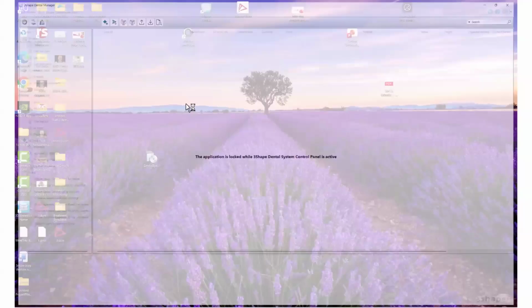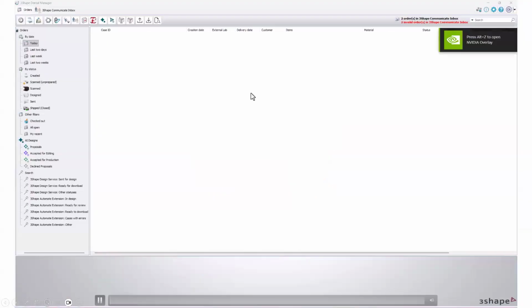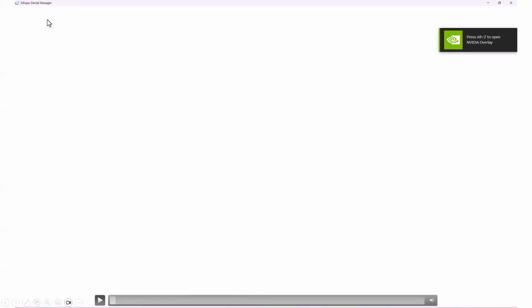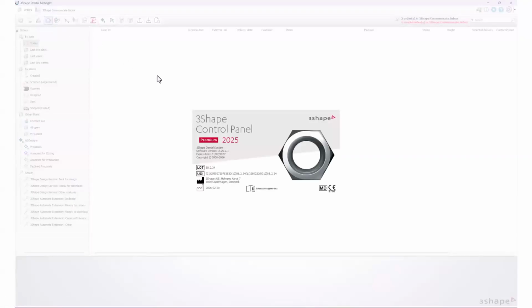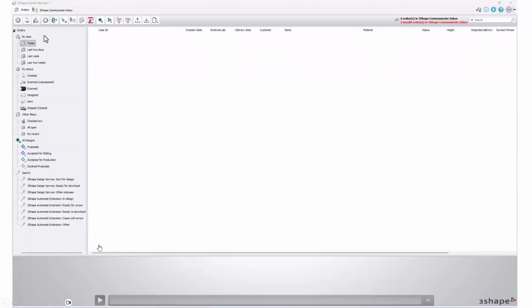That's going to save both changes in the abutment section, but that change in the bar design that we've just made. Okay, the next option will be to, of course, go to the next slide. And here I will just start with creating the order form.